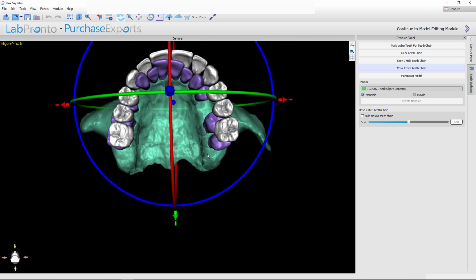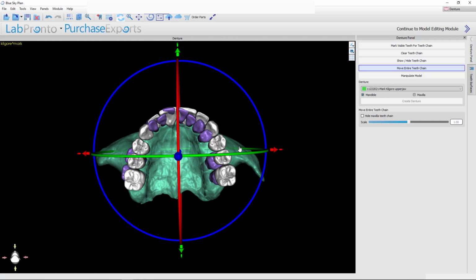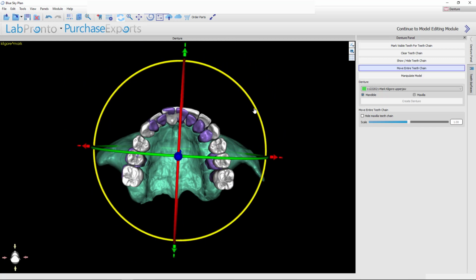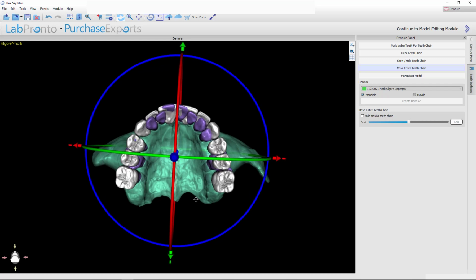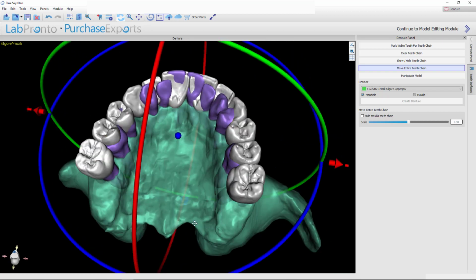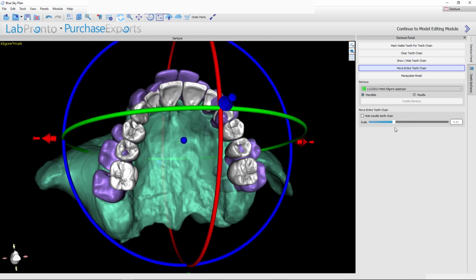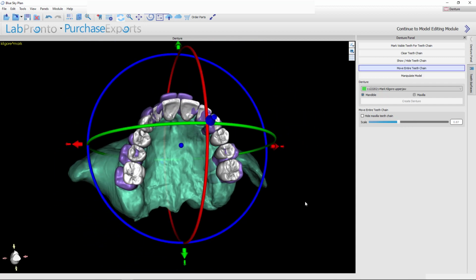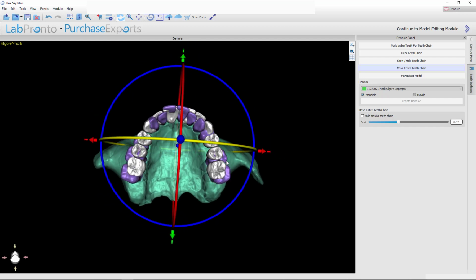And there we go. So remember, based on that lateral view, I don't want to bring incisal edge any farther out. So I'm going to go ahead and pull them back to the proper position facially. And now as I'm looking at this, he's got his first molar here. The library first molar is over here. So this needs to be shrunk quite a bit. All right, and as I do that, I'll have to realign it slightly.